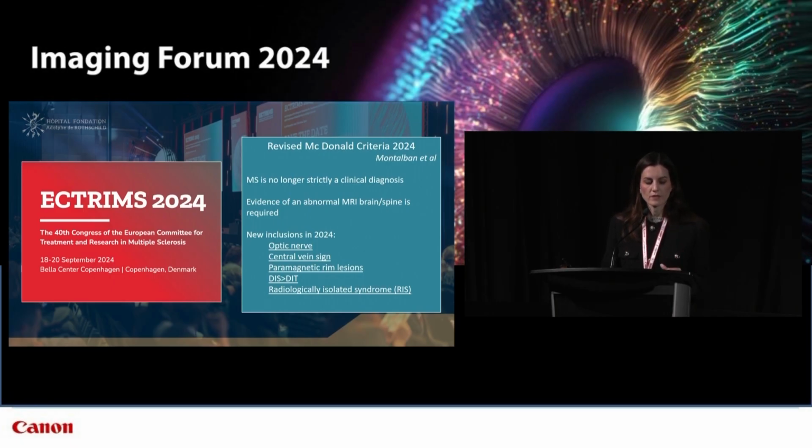So now our first case of an MS patient to see the effect of noise reduction thanks to ACE. This is a right posterior medullary lesion with a conventional filter on the left and ACE on the right, with improved lesion contour detection.